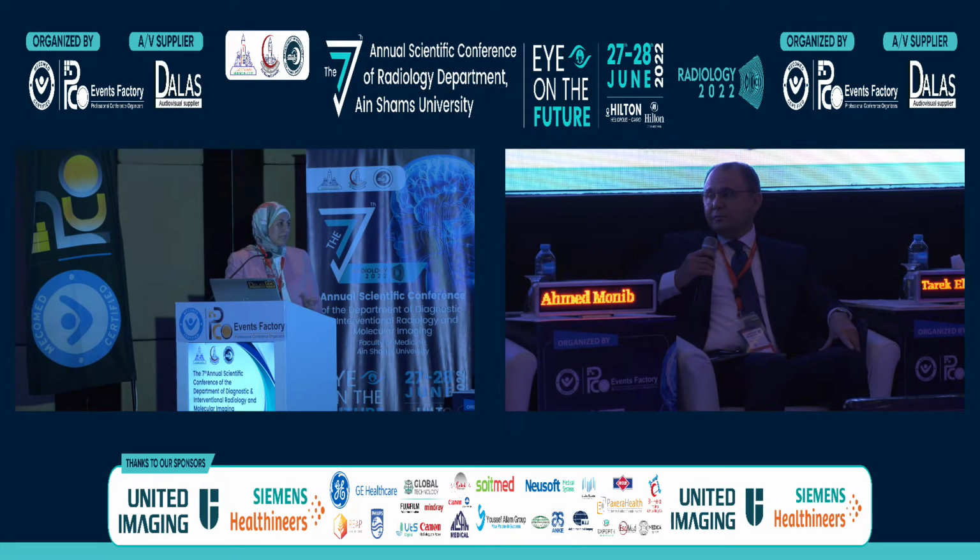فهو ده الديبيت اللي احنا يعني محتاجين فيه الكونتراست فعلا، فما نقدرش نأتمت الكونتراست دلوقتي. يعني ممكن قدام لما نستابلش بقى يعني الداتا تطلع more consolidated نقدر نقول ان احنا ممكن نعملها without contrast ونخلي الكونتراست recommendation for special category.